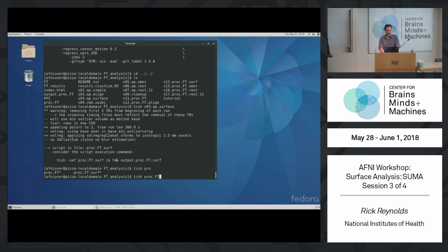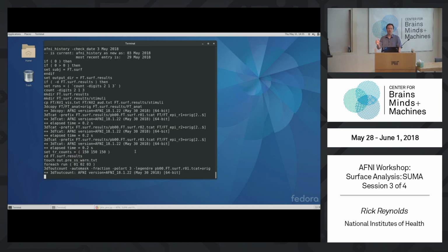So just get it running in some way. I'm just going to copy this whole command. Well, let's just start the thing in any case and then take a break, okay? So I'm just going to paste this and then we're off and running.